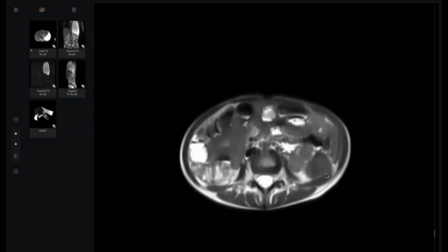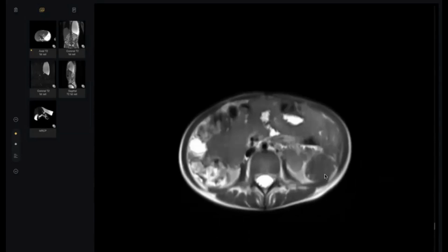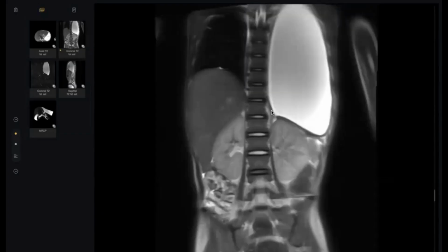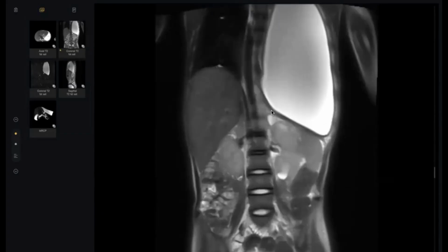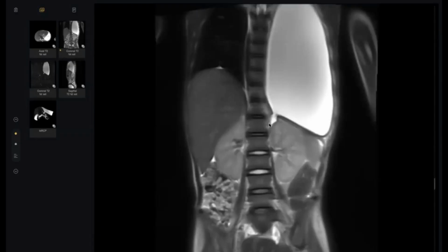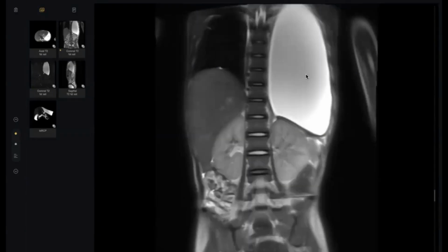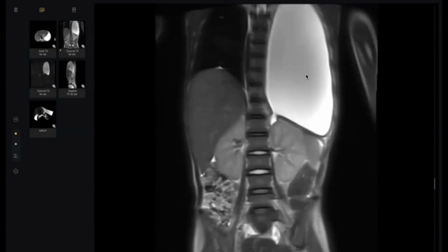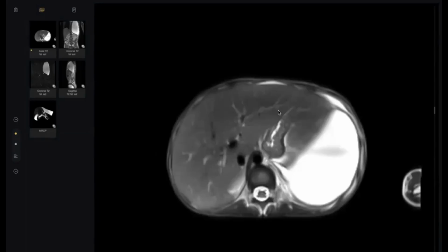You told me about two pathologies, pleural effusion and pancreatic atrophy. Follow this, please. What is this? Sir, it is communicating with the pancreatic region. Maybe there is chronic pancreatitis with a pseudo pancreatic cyst.